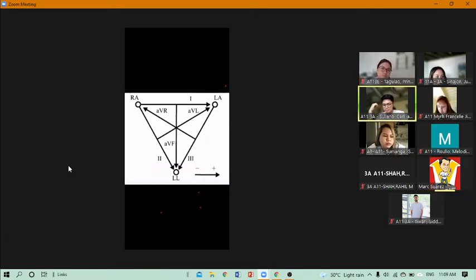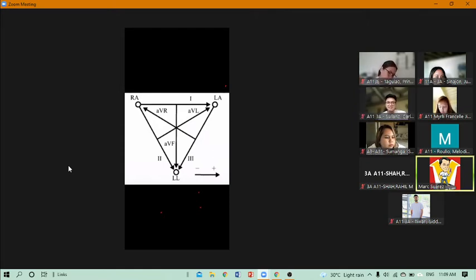Why? Based on the precordial leads. Base of the precordial leads, no? It involves the atrium as well as the majority of the ventricles, the left ventricle, right? So V1 and V2, di ba? So V3 and V4.